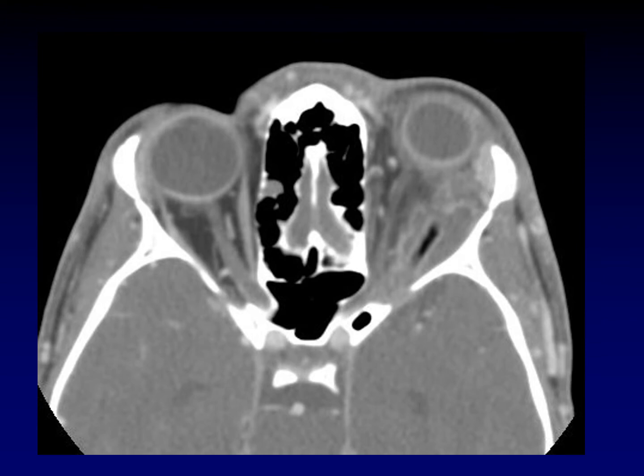Remember that wooden foreign bodies are of low density on CT. There's a lot of air within the wood itself, and so what you're looking for is gas. You can usually tell by the configuration of that gas whether it is free gas that has been driven in by the trauma or whether it is gas within a foreign body itself. The gas that has been driven in tends to be spherical, small bubbles, whereas if you see gas in a linear configuration as seen here, that's more likely to be a wooden fragment.